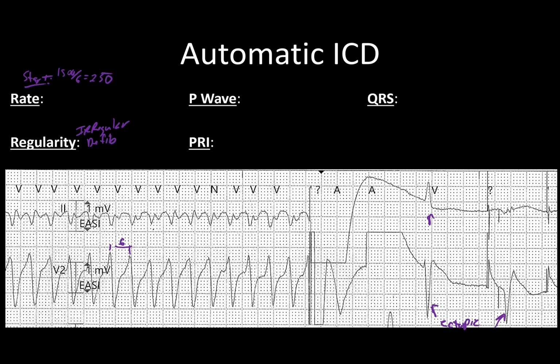They're probably ventricular contractions of some sort. I'll just leave it at that, and we can go a bit further in a bit. In terms of the truly paced beats that we have at the end, there is pacing.